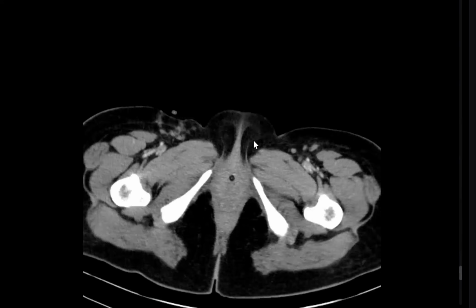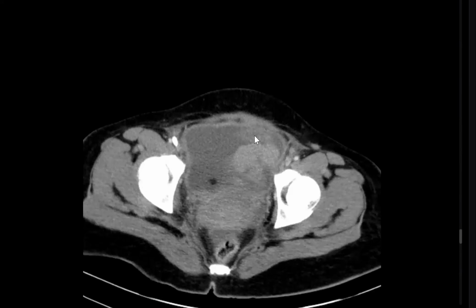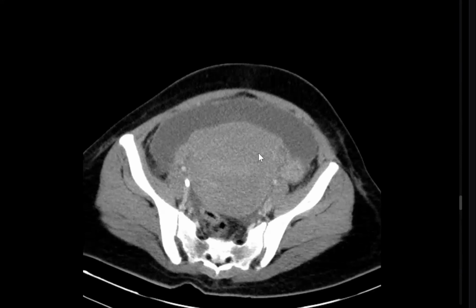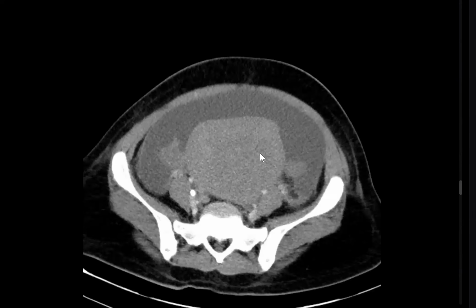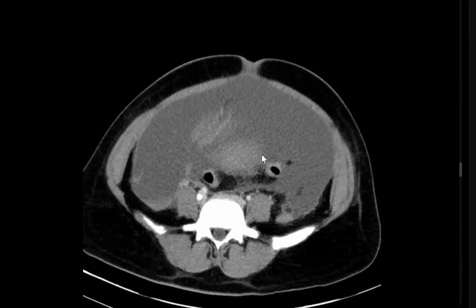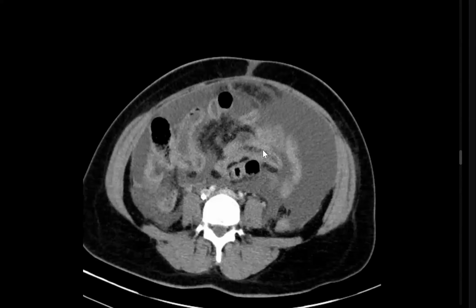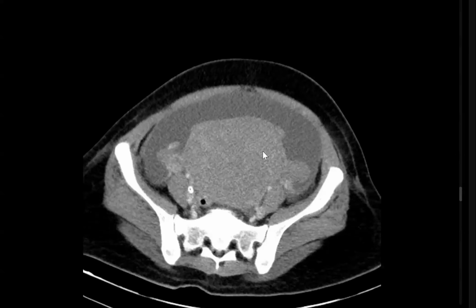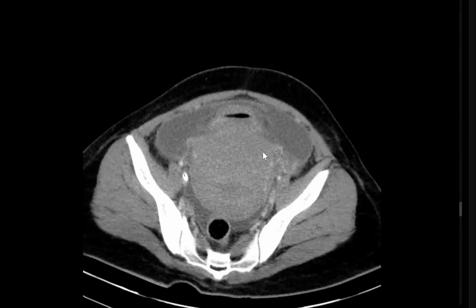So I cannot find any scar in this area to suggest a lower segment cesarean section. Okay, assume there is a previous cesarean section. So you are looking for any mural defect within the uterus, any area of thinning out, any area of dehiscence. Very good.